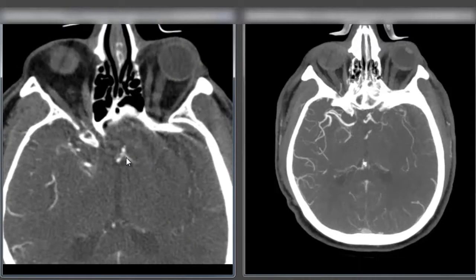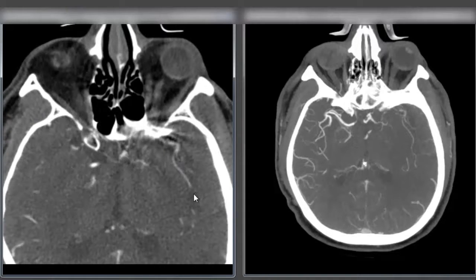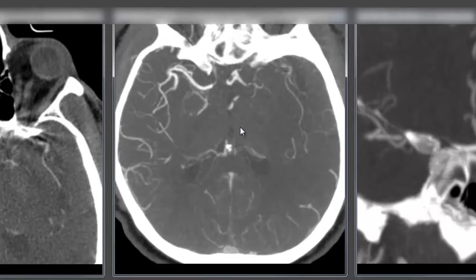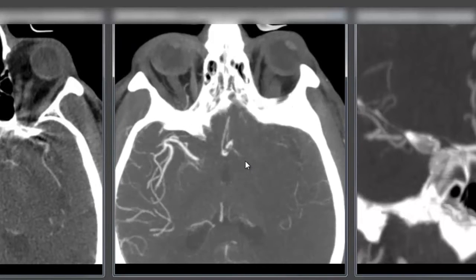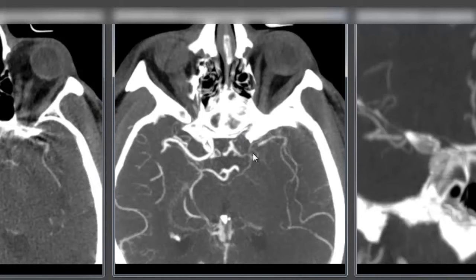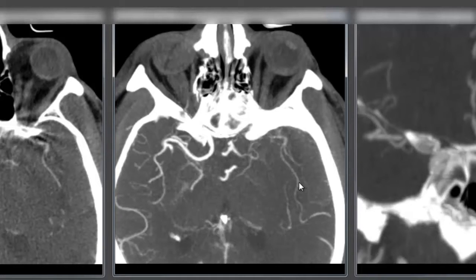We see a little bit of contrast filling in the anterior cerebral arteries here, very little to speak of, just a small amount of contrast in the middle cerebral artery, a little bit more distally from that clot. And now if we look at the axial thick MIP reconstructions, we see a similar picture but better visualized. Again, we see the normal carotid here, no filling of this carotid, which appears to be a clot at the carotid terminus with some reconstitution by collateralization down to the level close to the clot in the middle cerebral artery, but very thready contrast opacification in the MCA territory.